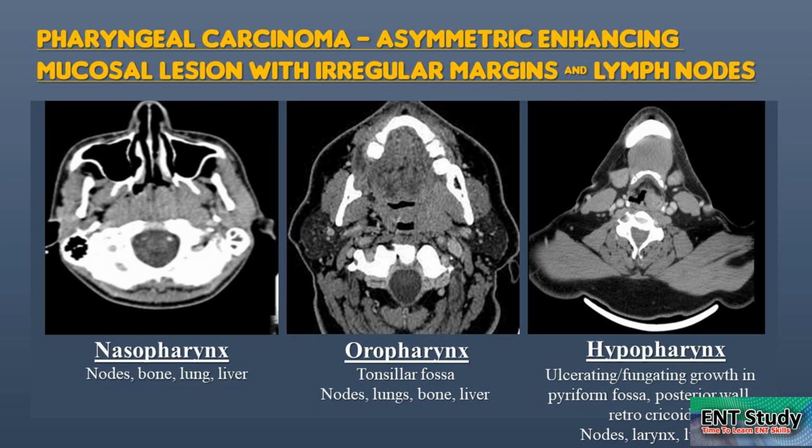If it is clear, plain fat, it's very good, like this. But if there is something grayish in between, then this is an enlarged lymph node. It should ideally be very clean and clear like this.